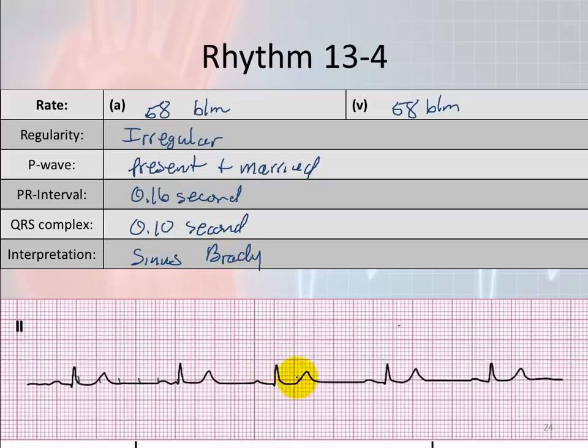And this is your PAC right here. So we know that the third beat is the PAC. That's a different P wave, as you can see from that P wave right there. And the literature I got this out of with the PAC, remember the P wave is different, but the QRS and T waves are normal. They're all the same. The book I got this out of said it was a non-compensatory pause.